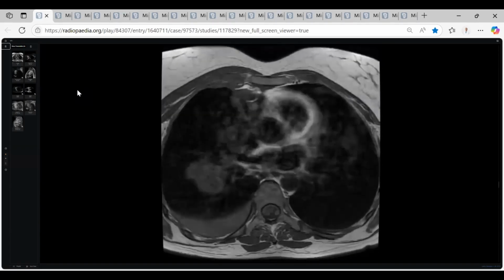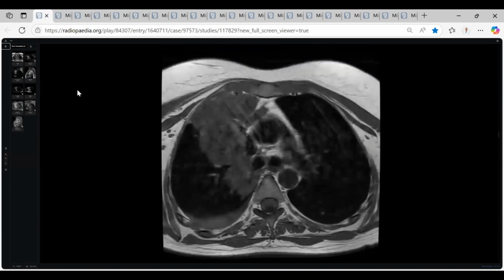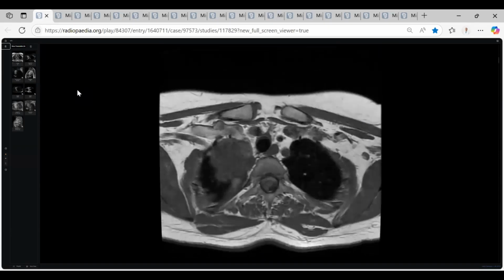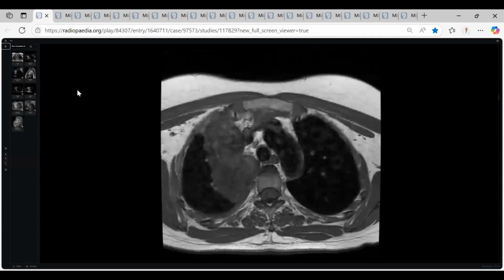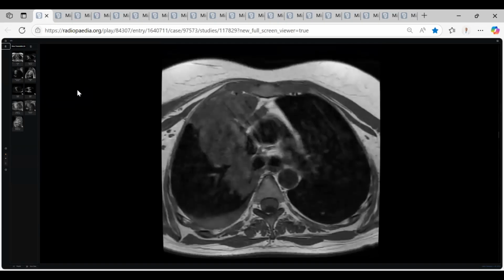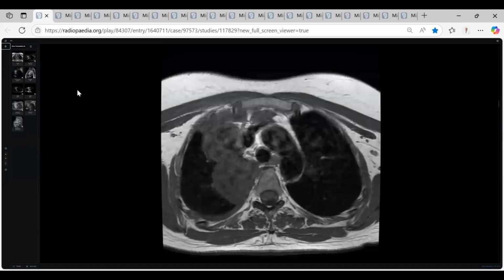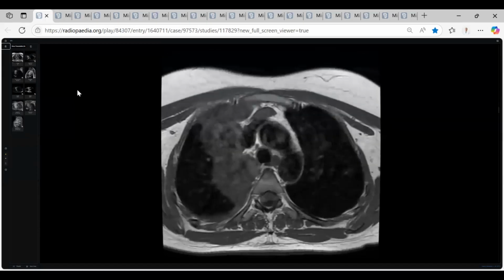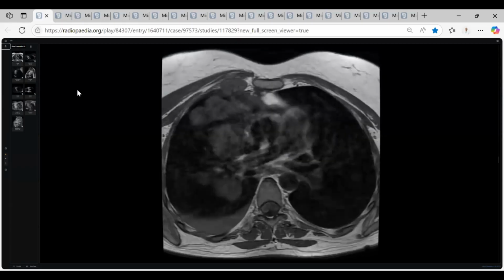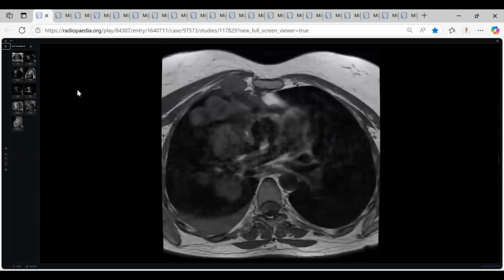So I am presented with an MRI T1 study, scrolling from down to up, and I find that there is a mediastinal mass lesion. This is a heterogeneous, lobulated mass, right-sided mainly, and extending beyond the esophagus. Why mainly right? This is completely right-sided. The mass extends in the anterior mediastinum to the right.